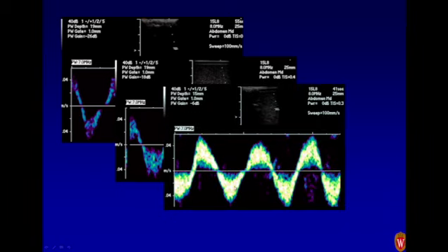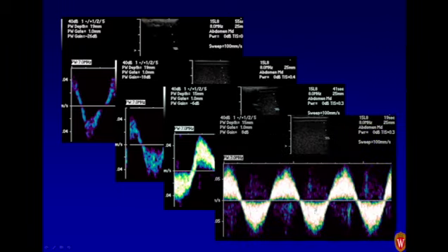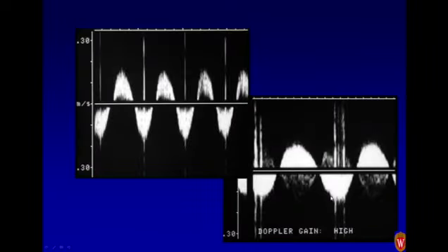Really bright tracing, right? But what's this? What are you starting to see here? Let's turn that gain up even more. Okay? Systolic window is almost completely wiped out. And look at this. There's something that's going in the other direction, right? Wrong. There's nothing going in the other direction. This is just a block of gel, and I'm moving in this way. What's going on here? This is that mirror imaging in the tracing.